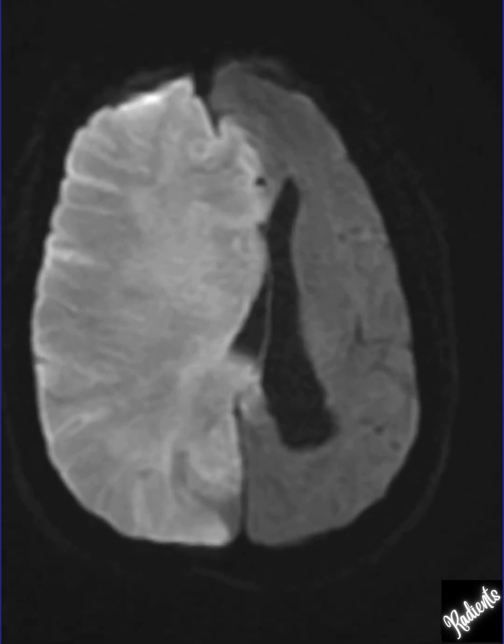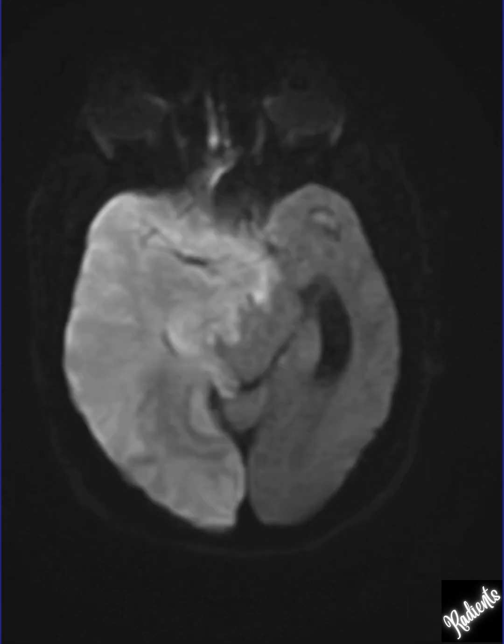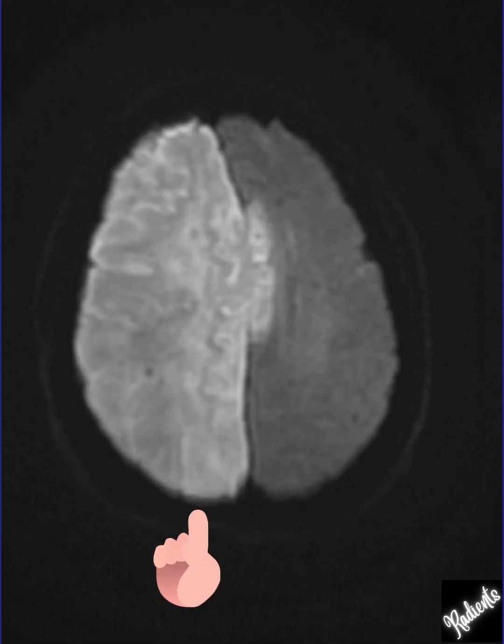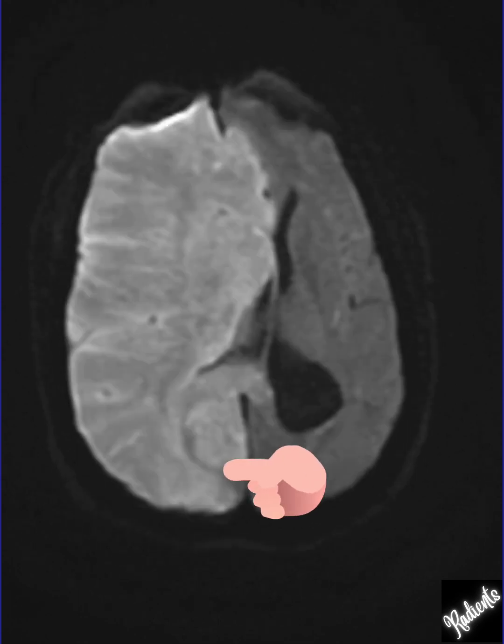On your screen, you can look at the DWI image of the brain, an MRI brain DWI image of an elderly female. She was around 75 years old, and what we can see here is the entire right cerebral hemisphere appears to show diffusion restriction on DWI. And if we look carefully, it's actually also involving the PCA territory.